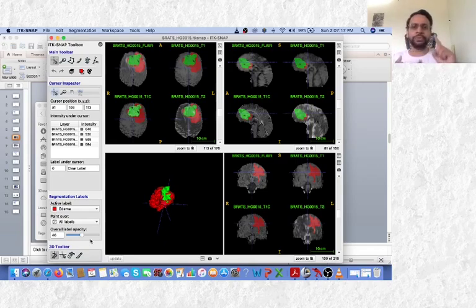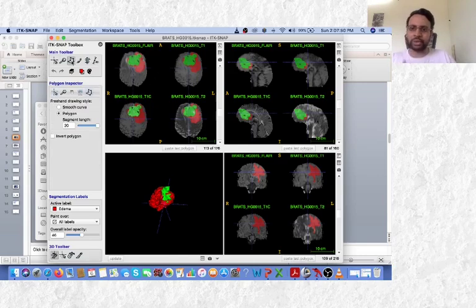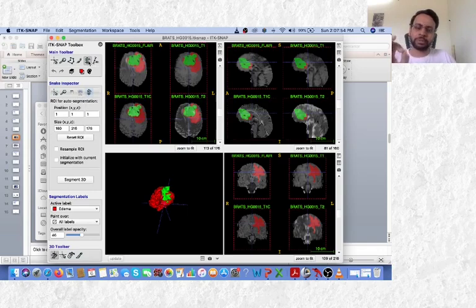So as I mentioned, this is the tool that you could use for visualization of your images, visualization of your segmentations, either ground truth segmentations or segmentations that you have obtained as an outcome of your algorithms. You could overlay them one on the other. You could get their statistics. If you want to create your own ground truth here, this has tools for performing the segmentation. So for example, I'd go here and do that, and it also has some basic methods for performing the segmentation.